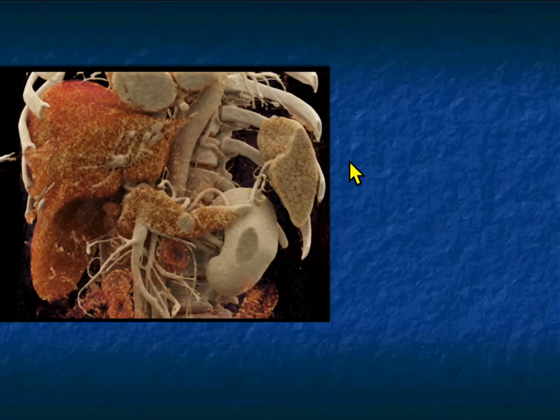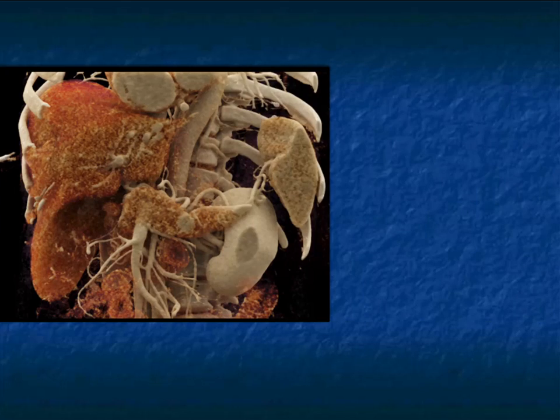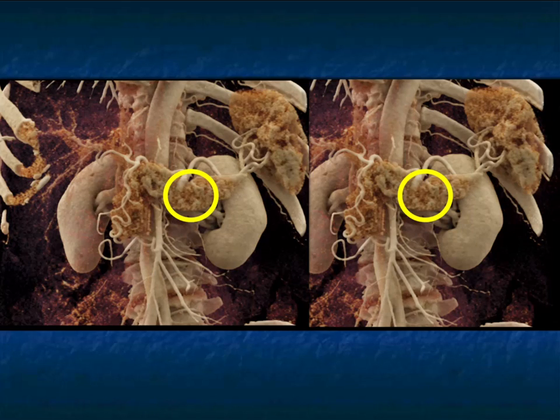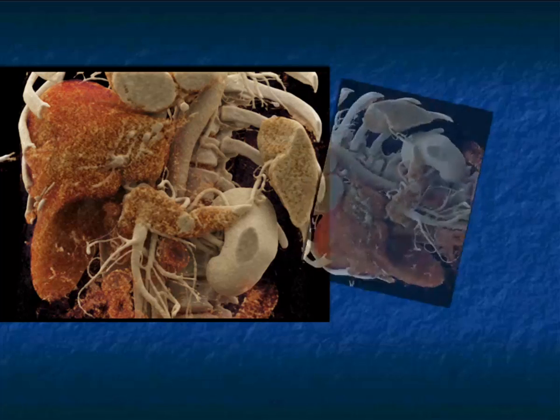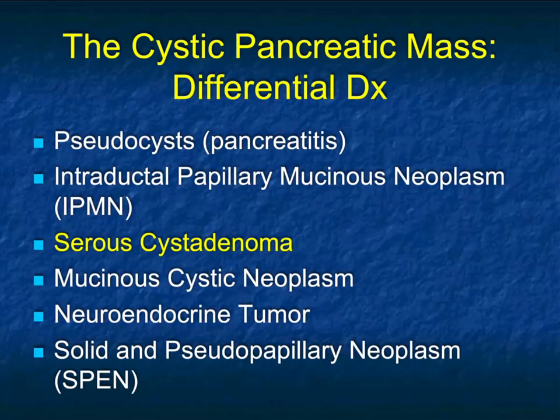And then you go to venous phase, and look how obvious the lesion is. So not every neuroendocrine tumor is best arterial. Some are best venous, but this is a nice example showing you, although we don't see the mass per se, when you go backwards on the cinematic, you can see the textural changes in the gland where the tumor was. So both in neuroendocrine as in adenocarcinoma, we may be dealing with textural changes that we don't appreciate when we look at the axials alone, but this becomes very obvious. And so this patient, because the lesion was relatively small and the patient asymptomatic, it was biopsied, low grade, and the patient was simply followed.